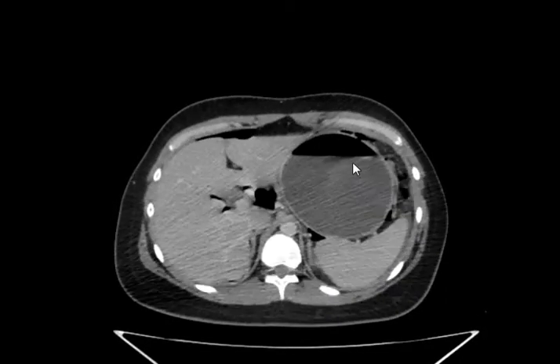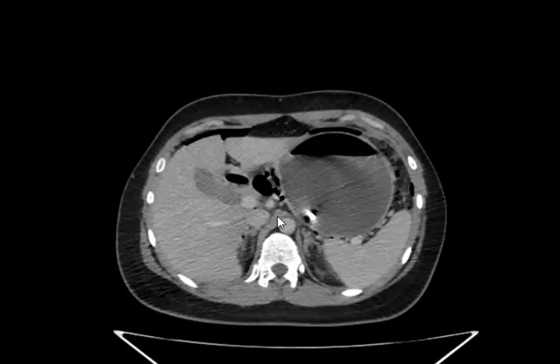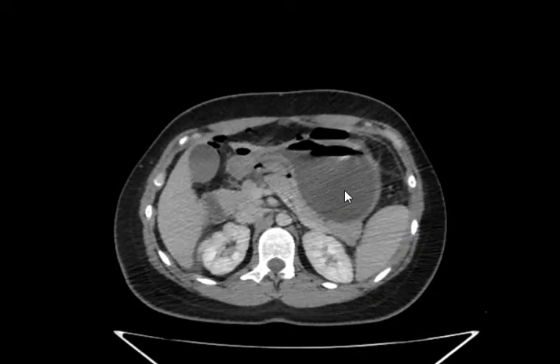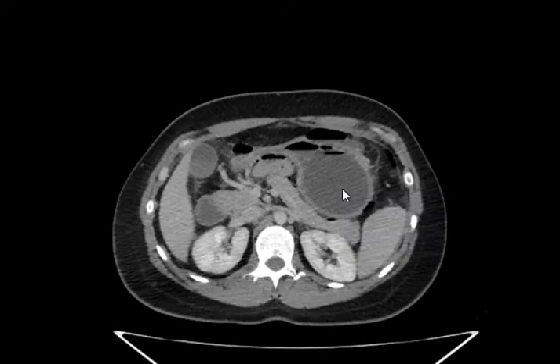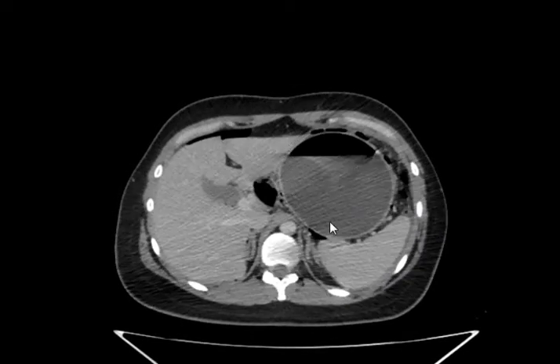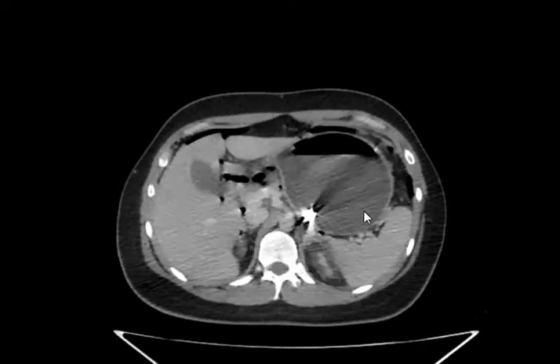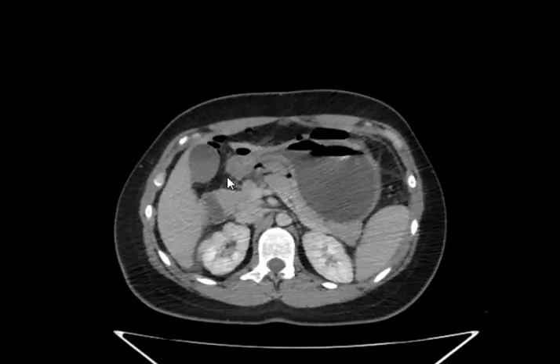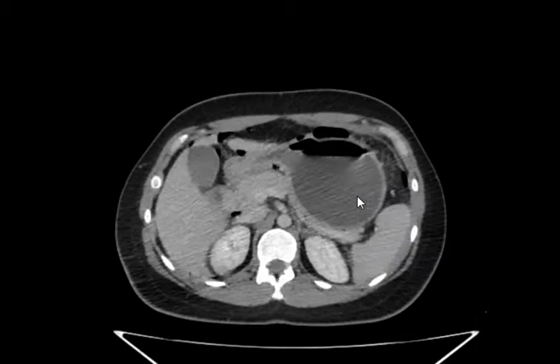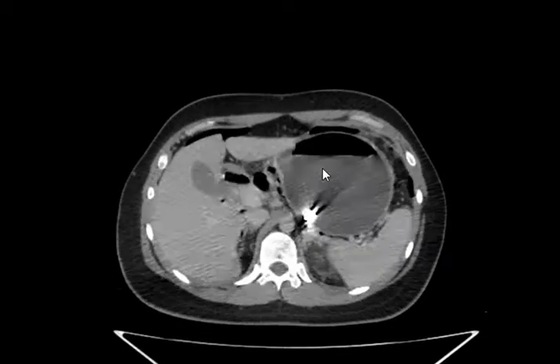Where is the stomach? It's dilated. Normally we see the stomach like this, rounded. Please keep quiet. It's a very round shape. But continuous with the duodenum. So, a diverticulum. You have a distended diverticulum. But is it the stomach or that one?